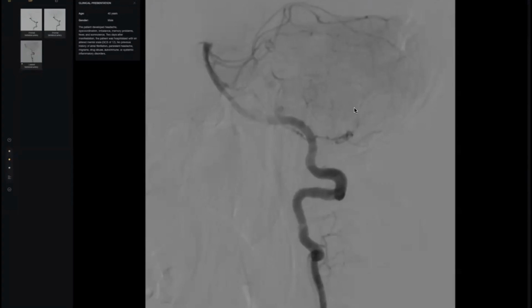No, first of all, look at the image overall. Oh doctor, the vessels are markedly attenuated, all the vessels, and it looks like there are many collaterals around it, and this artery looks beaded. So this is vasculitis. The examiner will be so happy. He will appreciate your style so much.